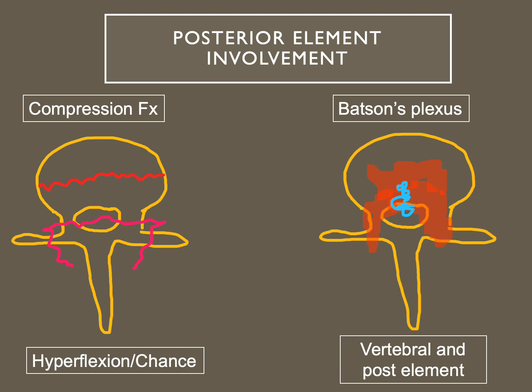From there, it will move into the pedicles, and therefore when we talk about radiographic findings, we talk about a blown pedicle or that winking owl sign, and that's usually because of pedicle involvement. So when you see posterior element involvement by soft tissue or by tumor, then that's obviously a malignant lesion. Whereas if you see just a fracture line, you see edema but no real solid tissue, then that ends up being a compression fracture.